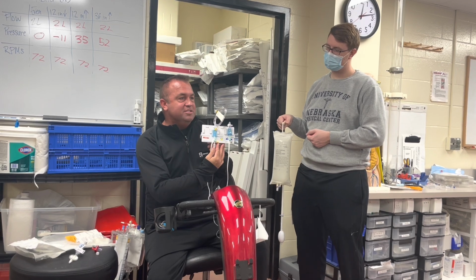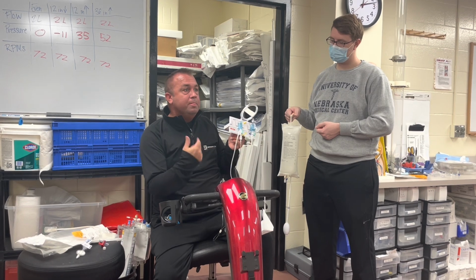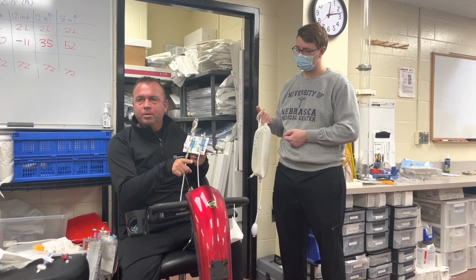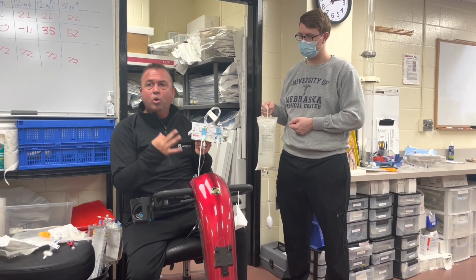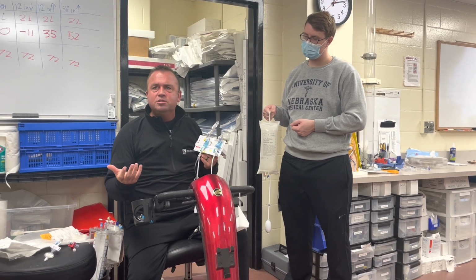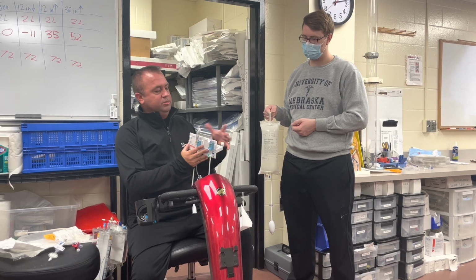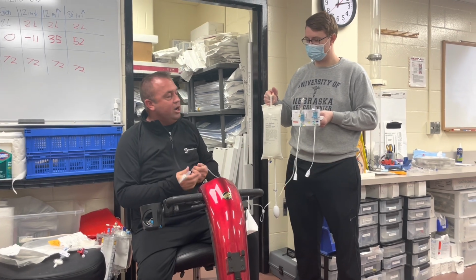Like I said, if you want to add a single one but only have one pressure bag, so you could measure 4 pressures if you have radial, femoral, CVP, and PA, you can even jerry-rig with another male-to-male connector and Y off even another one. It'll come off with the stopcock and then Y into your 4th transducer. I've seen as many as 5 or 6, all Y'd off the same pressure bag. It kind of looks like spaghetti and kind of a mess, but then you only have one pressure bag that you need to move from IV pole to the bed and back and forth, and one big transducer system with 2 clips. Anyway, so this transducer IV pole here is now all ready to go.